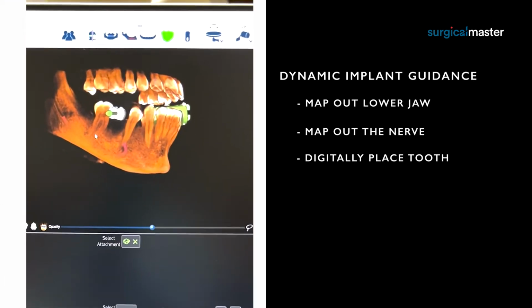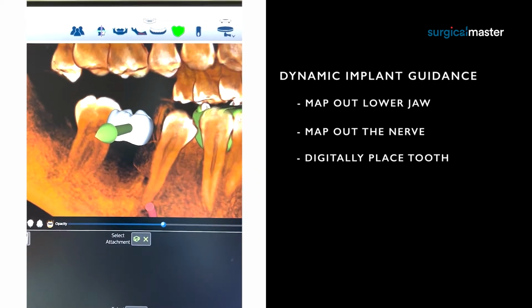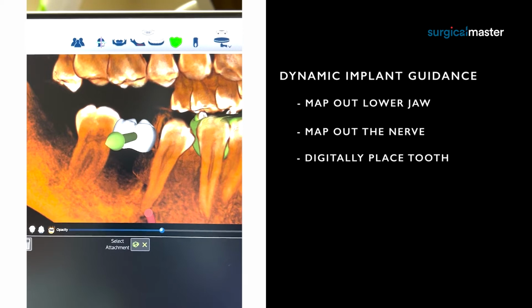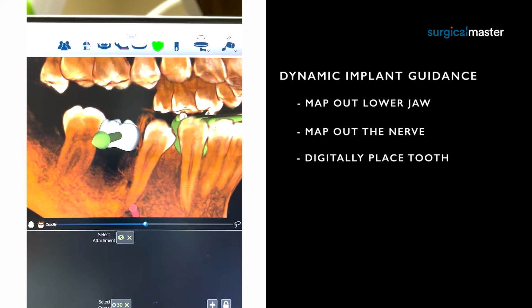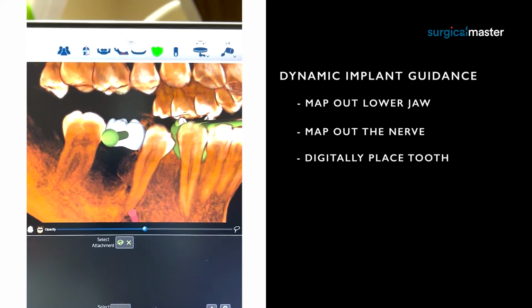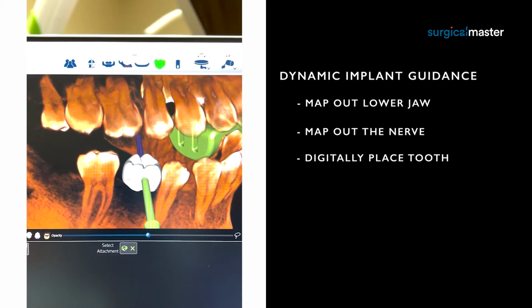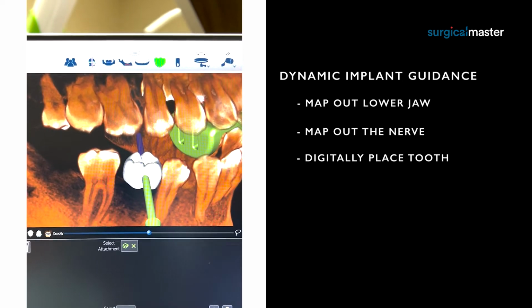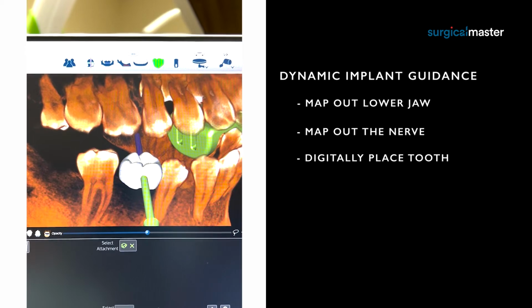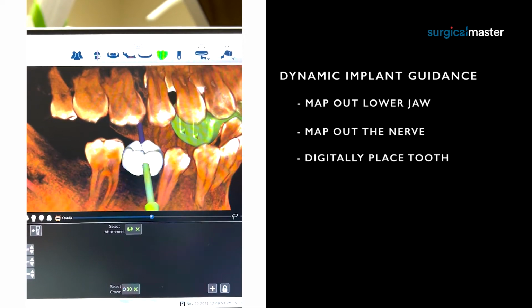and we can go closer on the 3D here. All right, and then we get it right in place where we want it. We twist it. It's a little low, so we're gonna raise it. So the level of precision is incredible here with what we're able to do. It's a little bit thin, so I'm gonna make it a little wider, the digital tooth. You see how it gets a little chubbier, and that's where the tooth is.